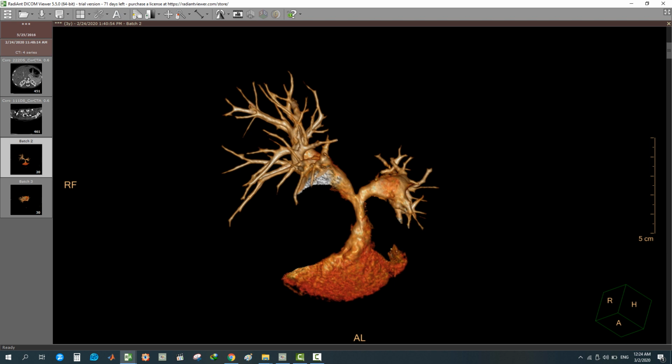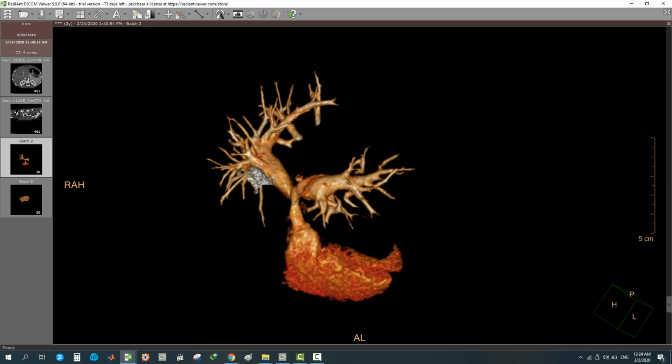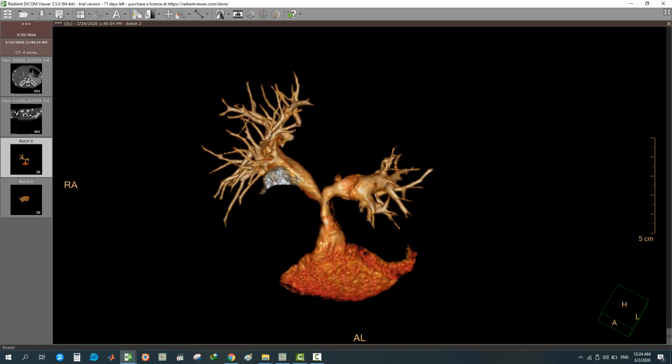Main pulmonary, right and left pulmonary artery branches, and this is the RPA, this one, the RPA. So you are dealing with average size or mildly stenotic RPA, but hypoplastic main pulmonary, and the proximal RPA and proximal left pulmonary arteries are markedly attenuated. But these pulmonary arteries are confluent, connected to each other.